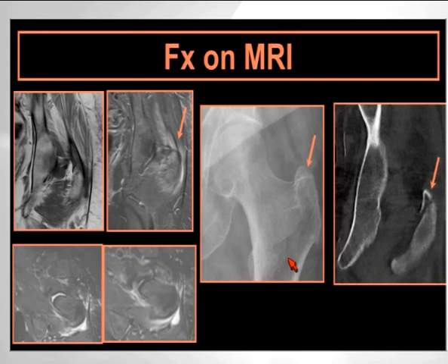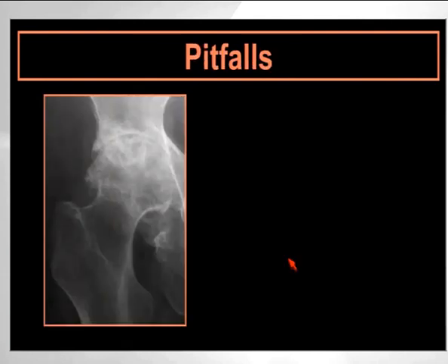Routinely in spine, even though we have MRI, we end up doing CT to look at those small cortices or even avulsion fractures. So we learned a lesson by doing this because retrospectively, I could see this tiny fracture. And again, if you're using MRI looking for fractures, you have to read almost like plain films, looking at every image. And again, this was seen only on one image. There are some pitfalls.